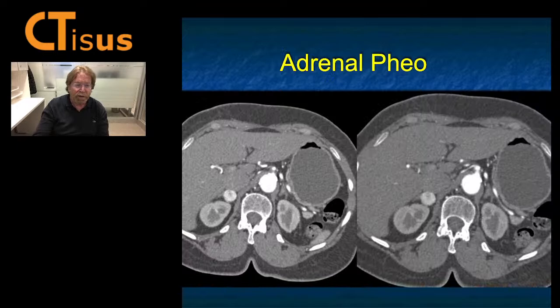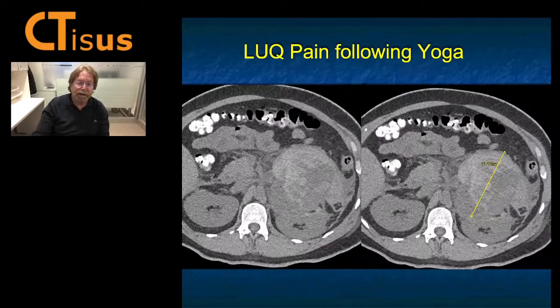Okay, what about this case? This was also in the adrenal pile. This is a great case from way back when. There's a large bleed. Now, the truth is it could be a retroperitoneal bleed on a patient on anticoagulant therapy. It could be a mass from the pancreas. It could be maybe off the kidney or the adrenal. Now, yoga usually isn't violent. This is not like you are having really violent yoga, but just was coincidental perhaps.